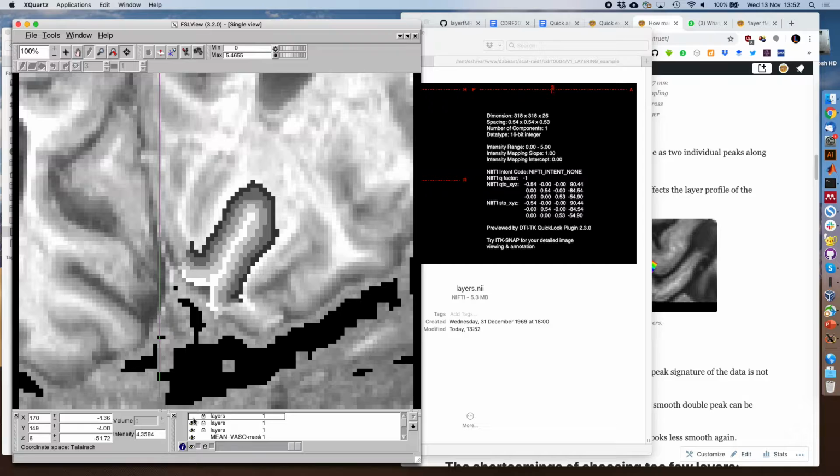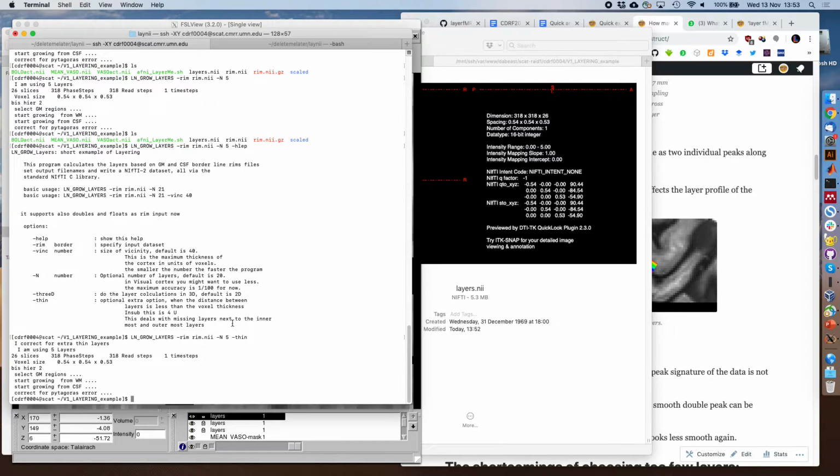So this is both 5 layers, but they're now differently distributed across the cortical depth. And I would not really use that unless you use like 2 or 3 layers. Then you need to do this redistribution. And this is, I think, done for InSub originally, who does some orientation decoding across layers with Sonji Kim.